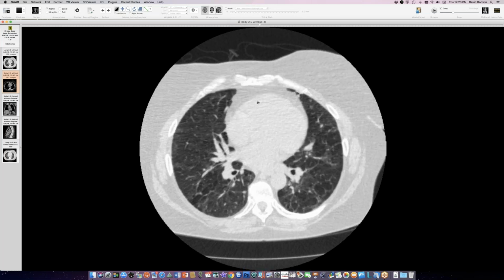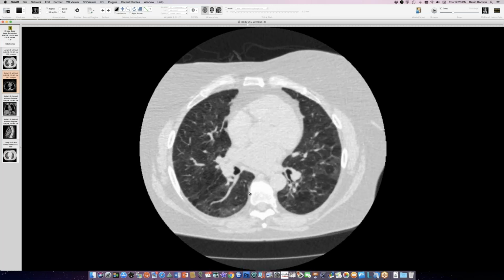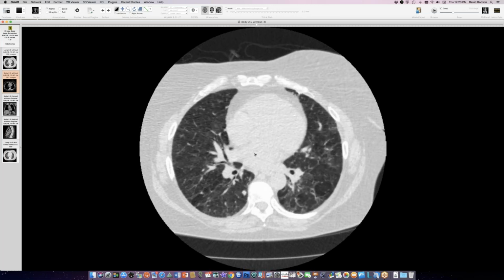I think it is low-grade silicosis. She's got a larger nodule down there that it didn't want you guys to see. Don't know what to do with that. Okay.